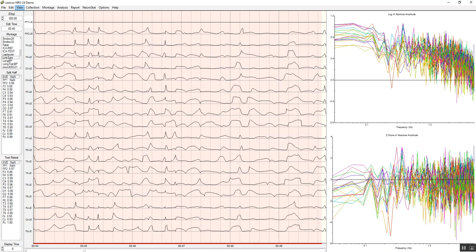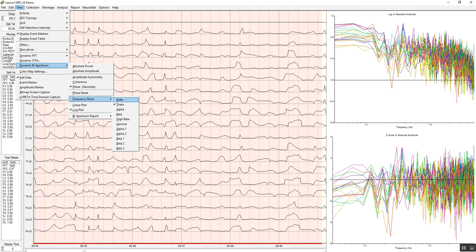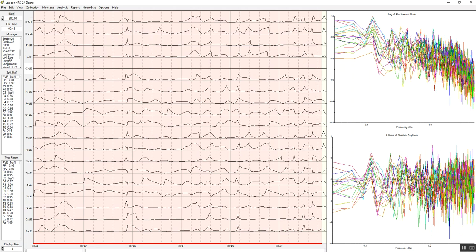It's not the same as cross frequency, although you're able to select the frequency which you want to look at as a base frequency, and then you look at the frequencies of the bursting between, this is FP1 and the rest of the brain. Or if you want to look at C3, click C3. P4, click P4.